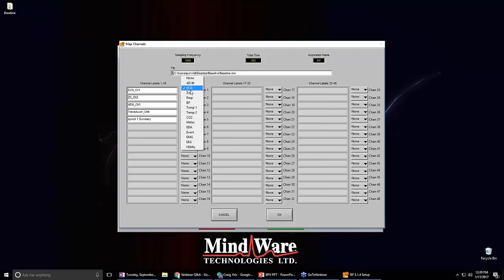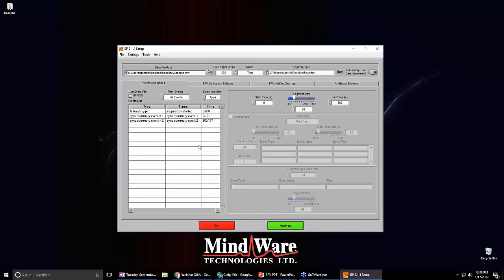and we will go ahead and marry that over to these channels over here. So ECG, you're going to want to make sure that's selected as ECG. Z0, we're going to get our respiration signal from there. And then our transducer module. This wasn't labeled. I'd probably label this something else, such as blood pressure inside of BioLab, but since we know that one's blood pressure, we'll change that to BP. And then our sync is going to be our event in this case. And we'll just hit OK.